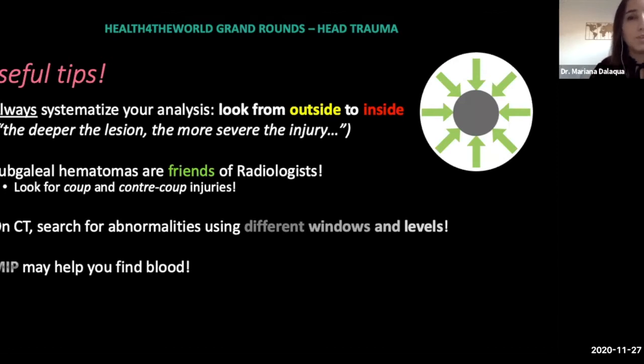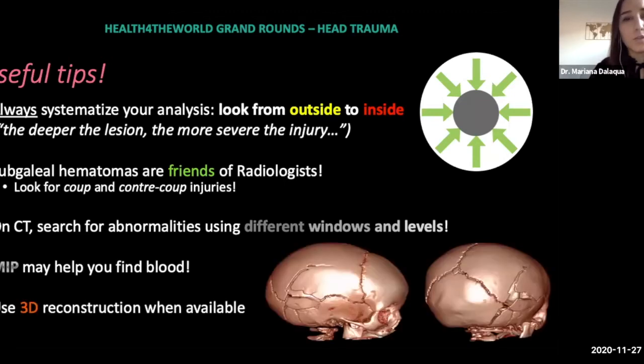That may help you to find the subtle subarachnoid hemorrhages. So use your tools. The same thing goes for 3D reconstruction.